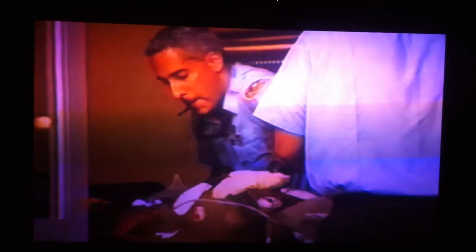Another form of asystole is called ventricular asystole. Ventricular asystole occurs when P waves are seen without any QRS complexes. This indicates that the sinus node is firing without any response from the ventricles.